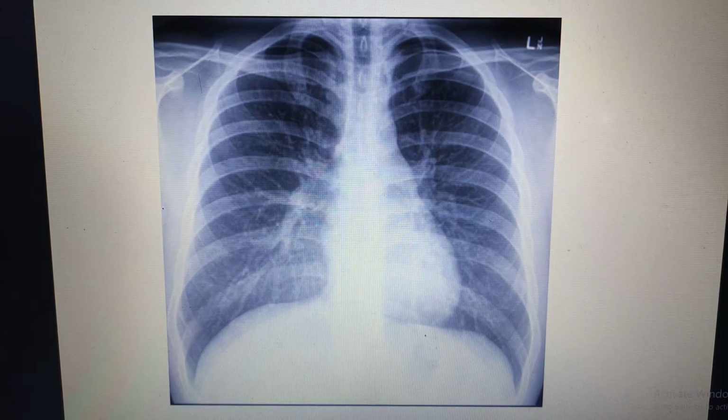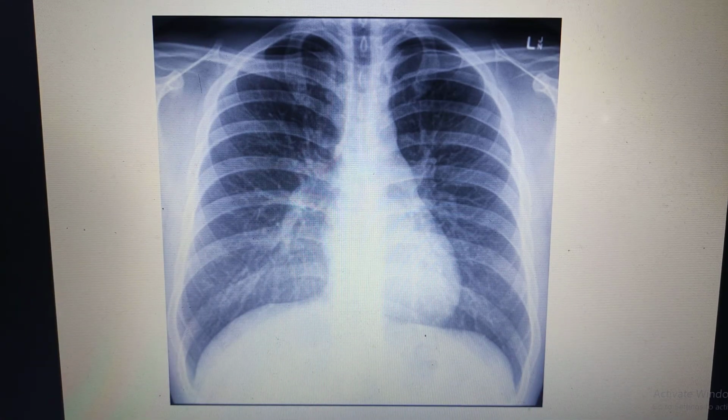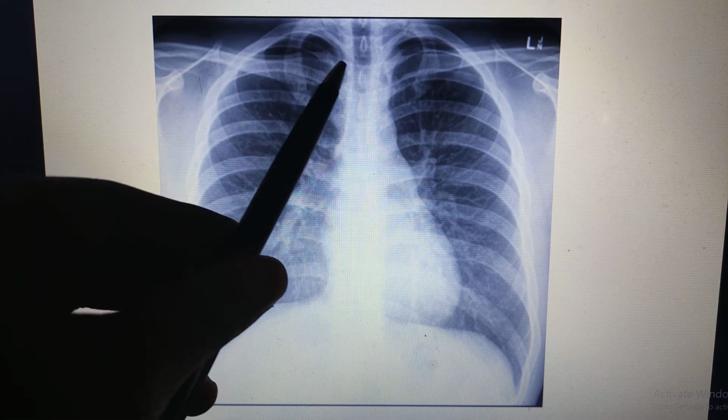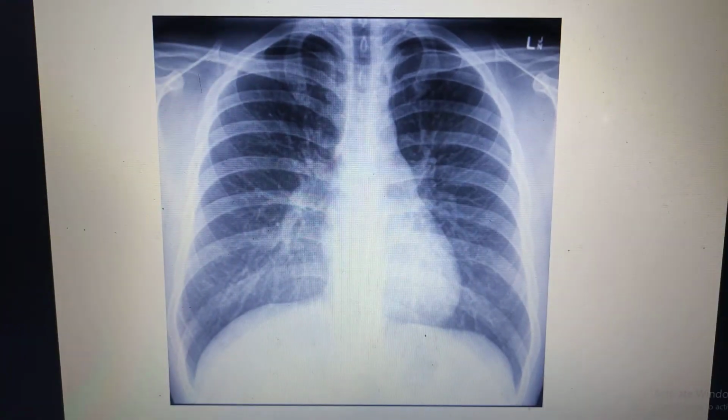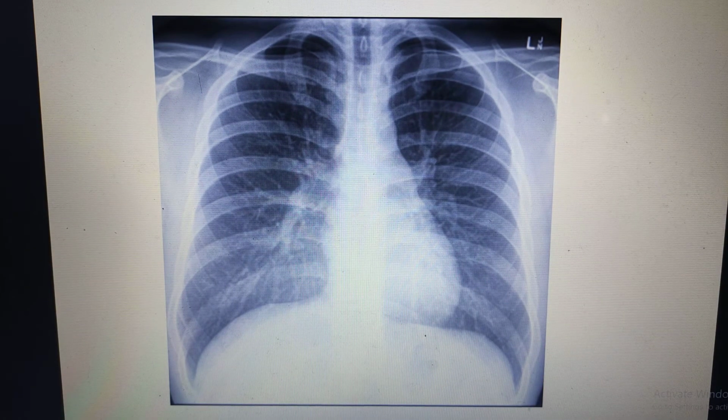Whenever you see, you have to make sure the trachea is centered. Now the trachea can be deviated to the left or right side, that is away or towards the disease side. This trachea can be deviated towards one side, or can be pulled to one side. Why will it be deviated away? Basic concept, it will be deviated away because something has to push. Maybe a mass, maybe a tumor, maybe something is pushing, or something has to pull. Why would it pull? Due to a negative pressure, negative suction, that is your fibrosis, or you have collapsed lung. That is the reason trachea will be shifted.